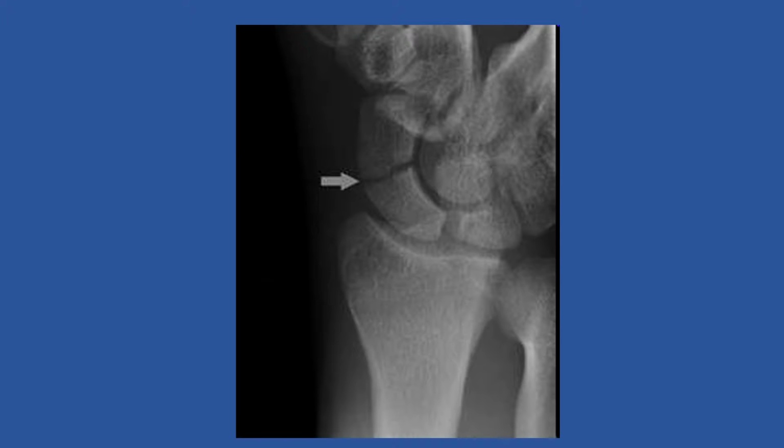You also have a navicular in your foot. If you go anywhere but the United States, it's referred to as the scaphoid. But here in the United States, we often refer to it as the navicular. Some people refer to it as the carpal navicular to discriminate between that and the tarsal navicular. But either way, the problem with a navicular fracture is that they are also notorious for going non-union.